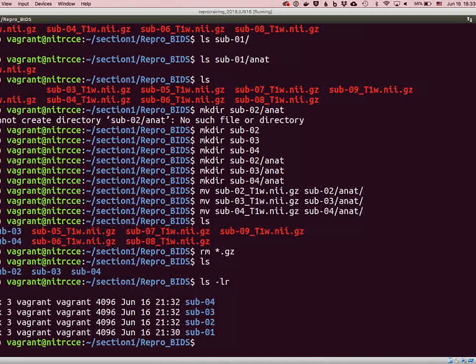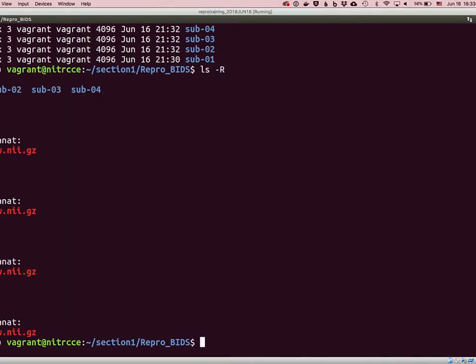Yeah. So don't try to put DICOMs in your anat directory or your BIDS validator will complain. Right now it has to be NIfTI. Is that an appropriate place for the DICOM if you had it? Not that I know of, but BIDS has a file at the root level that you can add called .bidsignore, and you could add all those files to .bidsignore, and then the validator will run, but you can still store files there, like DICOM.